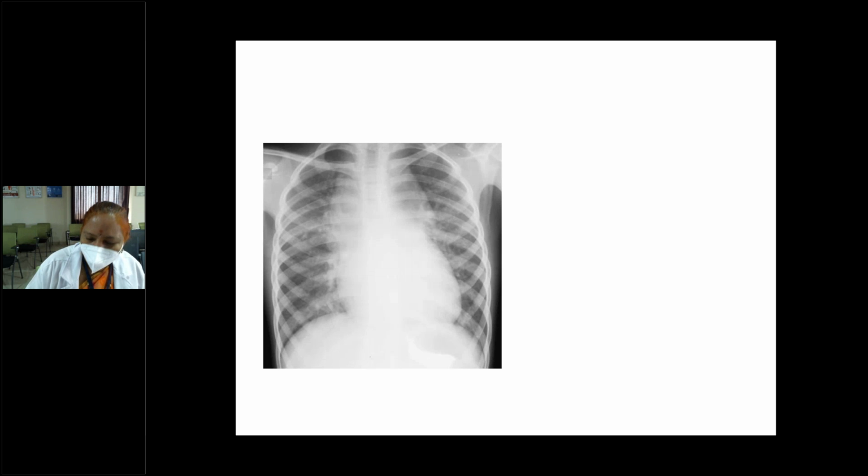So anybody? This X-ray. Be quick. Only 20 minutes is there for me. I have to complete this because last week also I took X-rays and this week I will complete. We won't put all these X-rays. A few will be selected from this. Because we are a regular batch, I'm telling each and every X-ray for your sake.